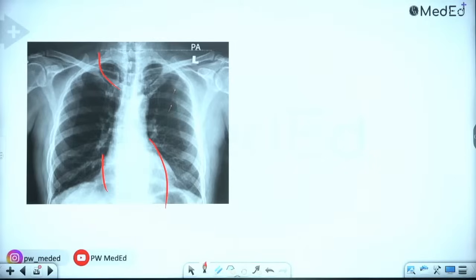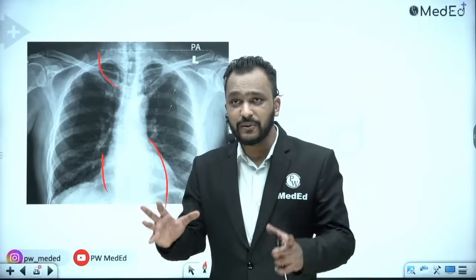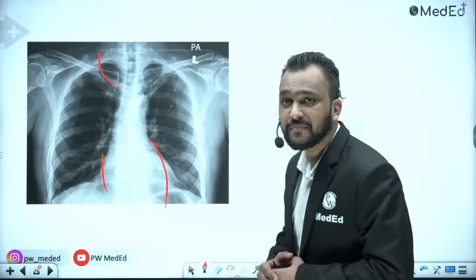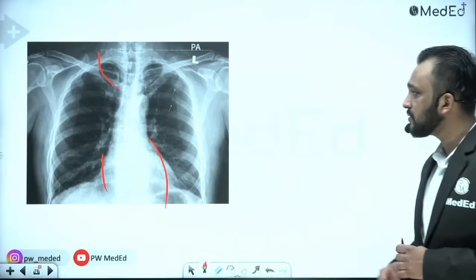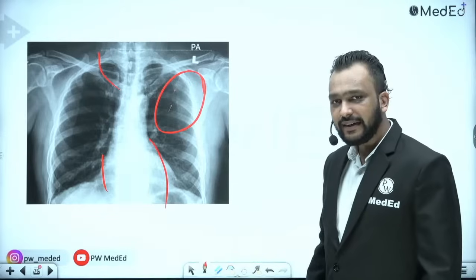Pneumothorax is not there. In pneumothorax, you will see a visceral pleural line. You will see a radiolucent area that is devoid of lung markings. Hila appear normal. Can you tell me the findings now?